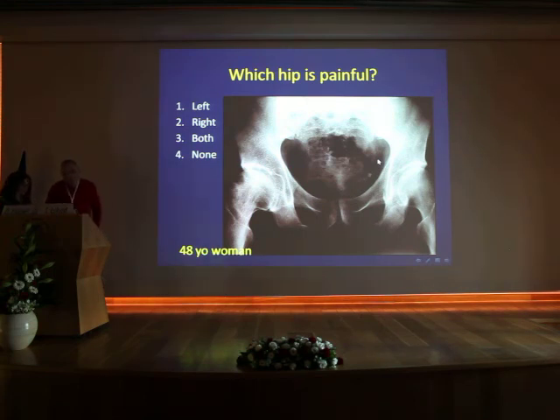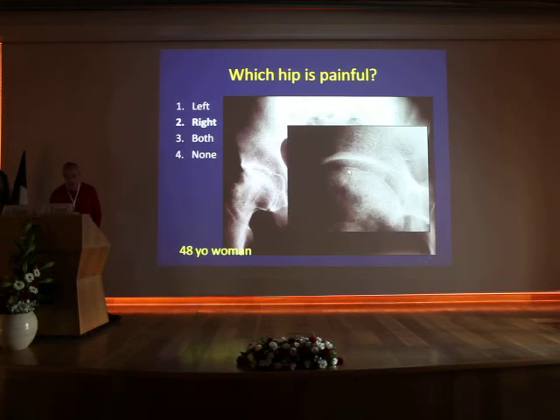This is a 48-year-old woman. She has hip pain, but which side is painful? Left, right, both, none. Okay, she has right hip pain. Anybody sees anything pathological here? Okay, let's do enlargement.